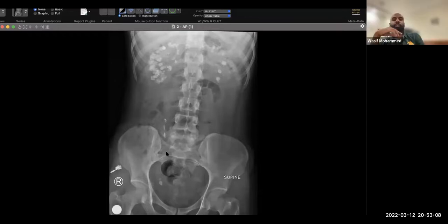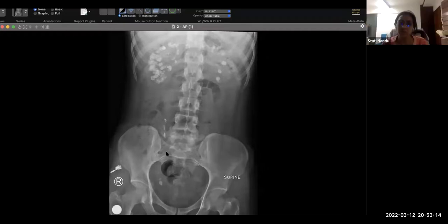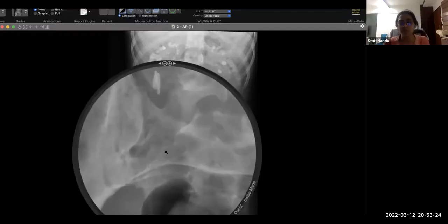So you said there is medullary nephrocalcinosis. Do you have a differential for this appearance? Medullary sponge kidney could also give a similar appearance. And in view of the ureteric calculus that could be causing the pain, I would suggest an urgent urology referral.